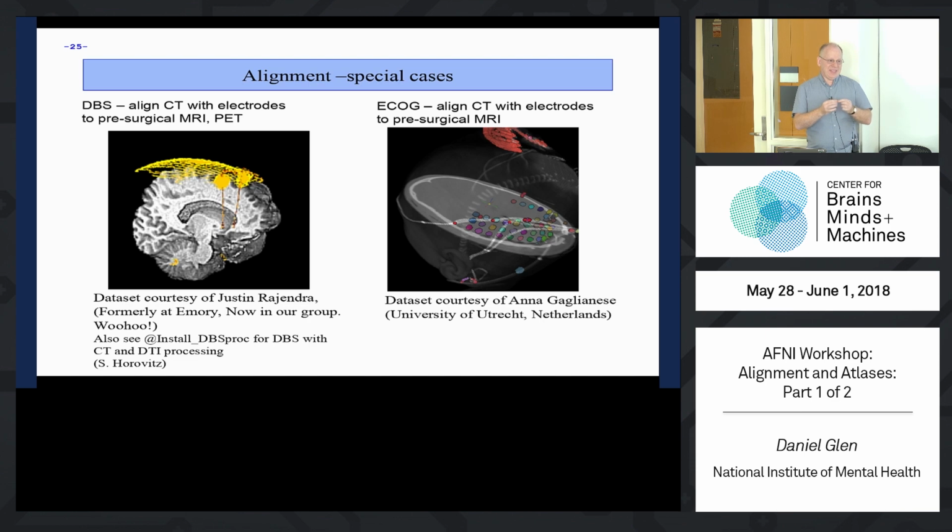You can see a small layer that is the actual skull. By reversing our T1 data set and then aligning it to the CT with a rigid body transformation, we could align these together. We use the same trick with ECOG data, which also has CT and T1 data sets, and we have this as part of the ALICE pipeline for dealing with ECOG data.